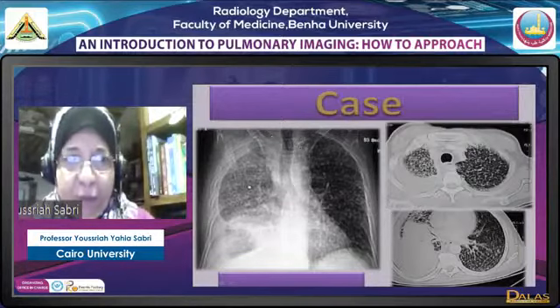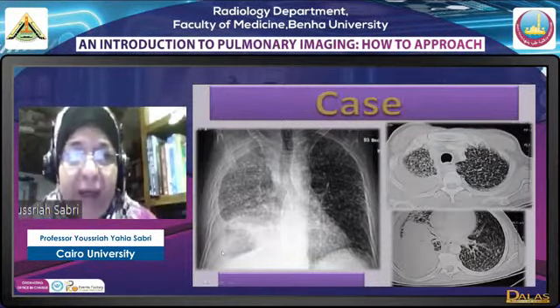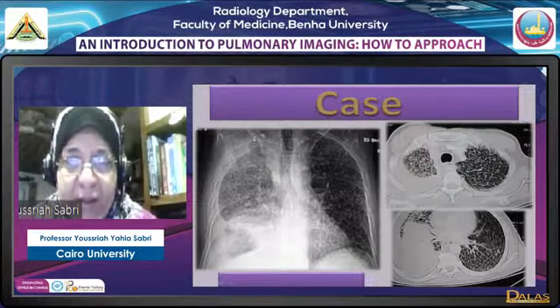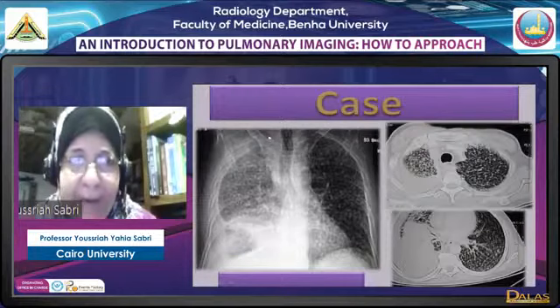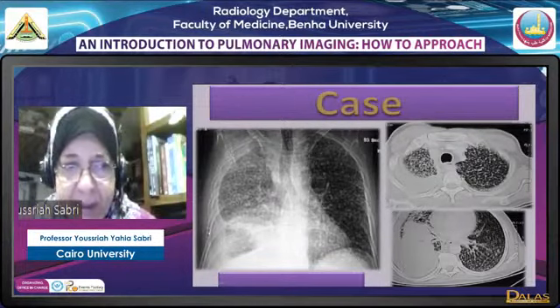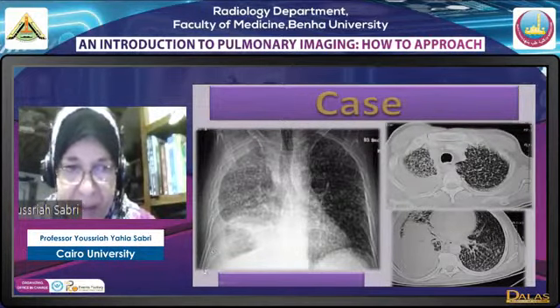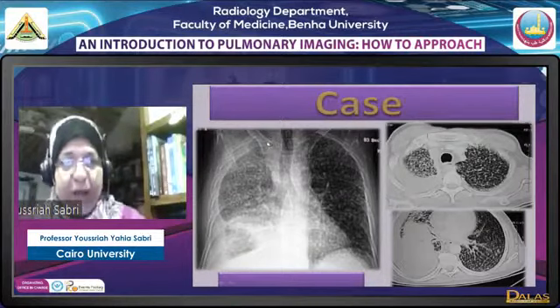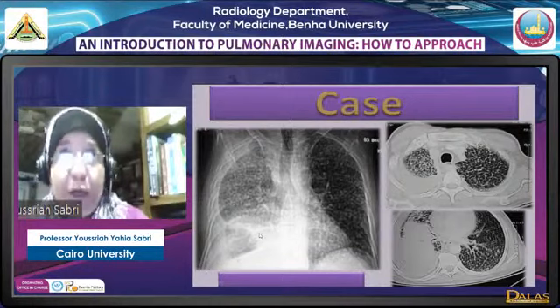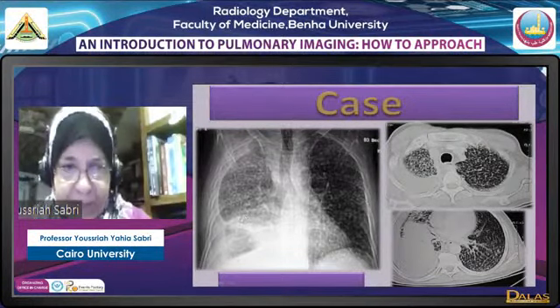Number one, if you compare both lungs, you will find veiling in the right lung because of the effusion. This is number one. There will be veiling, diffuse veiling, and then there will be here pleural capping. This is the apex here. There is a pleural capping here, okay? Because the water gathers in the most dependent part, which is the apex, and then it extends onto the lateral aspect and then basally. So we will have opacification apically, laterally, and basally, okay, in addition to the veiling. This is how effusion is seen in a supine film.